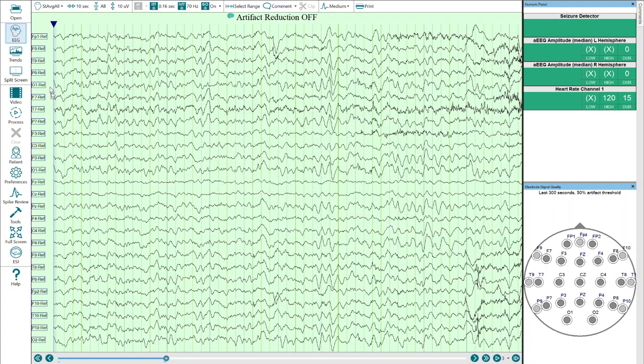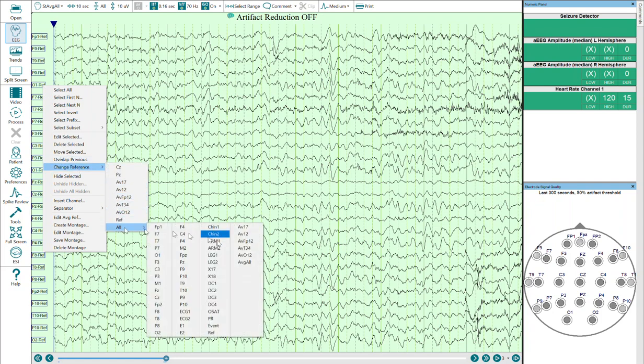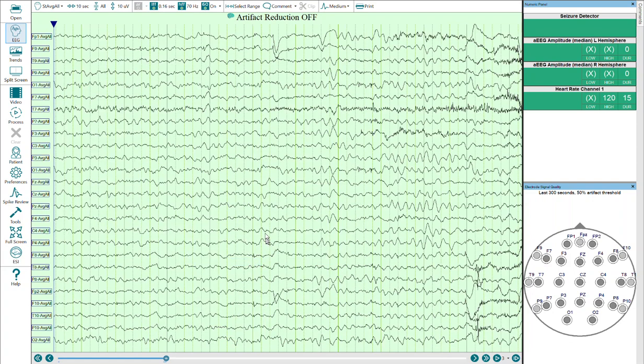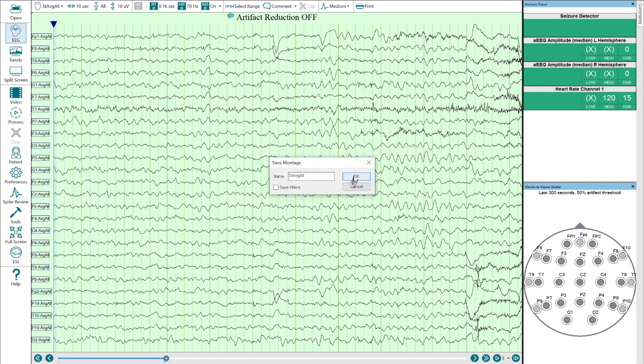Now this reference then becomes available, so I can right click, change reference, and I'm going to go to all, and there's my average for all. Now I can right click and save this montage. I'm not going to change the name, and there it is.